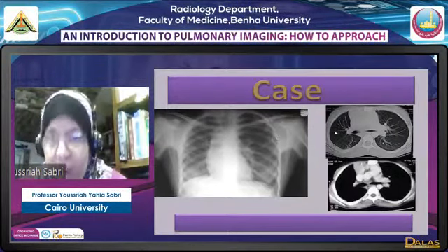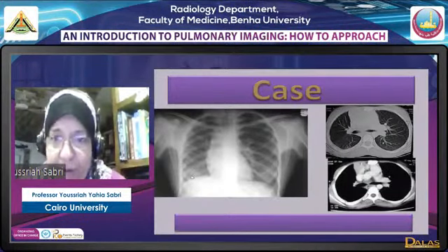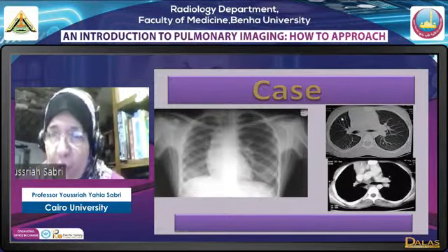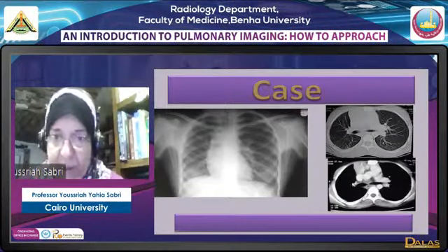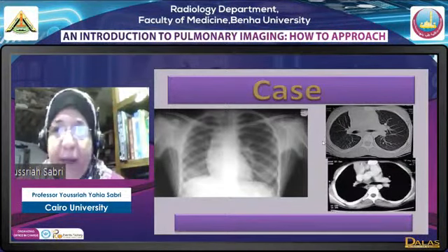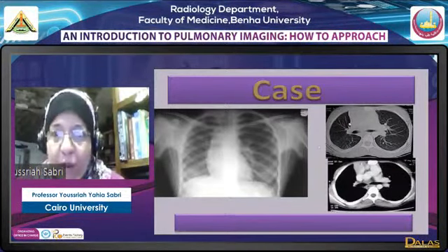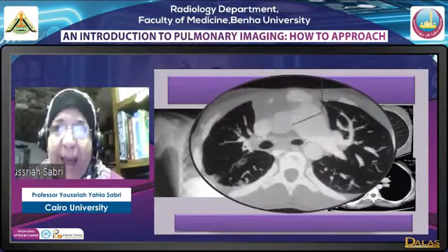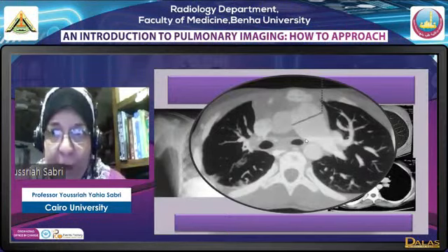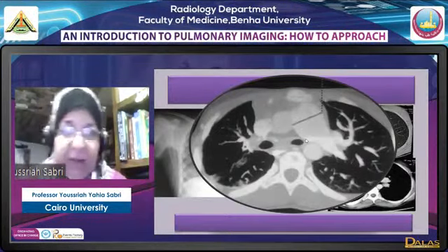Okay, now, is this lung only small or is it hypovascular? Well, compare the vessels in the axial images on both sides. You will find that the lung is small and hypovascular, and actually there are some abnormal vessels posteriorly. Why? What has caused this small lung? There is no lobectomy, there is no lobe removal, there is no lobar collapse. What is the cause here of this actually congenital hypoplastic lung? It's a small black lung, born as such.